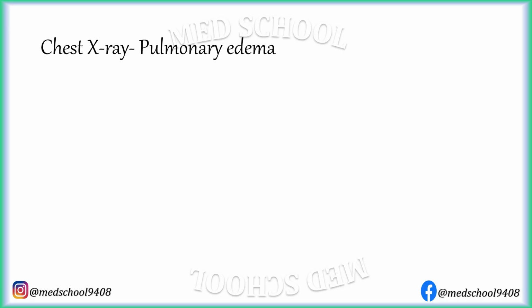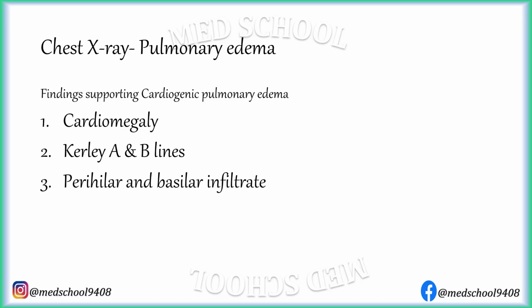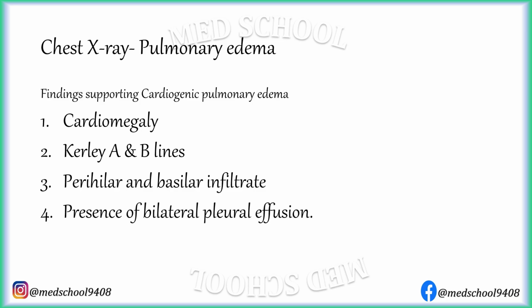You must be thinking if it is possible to differentiate cardiogenic and non-cardiogenic pulmonary edema on chest X-ray. Answer is yes. Findings that support cardiogenic pulmonary edema are cardiomegaly, Kerley A and B lines, perihilar and basilar infiltrate, and presence of bilateral pleural effusions.